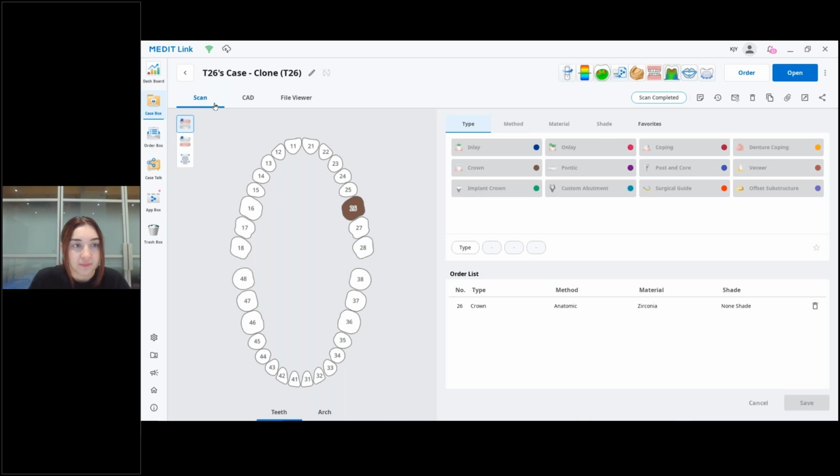Just a reminder to everybody that if you want to get your pre-operation data scanned in Medit Scan for Clinics, you will have to use one of those options for maxillary or mandible. When you click on this icon in Medit Scan for Clinics, you will see that the pre-op stage is being activated, where you can scan your pre-operation data. Then after the preparation, you scan the prepared data. So this is what we use.